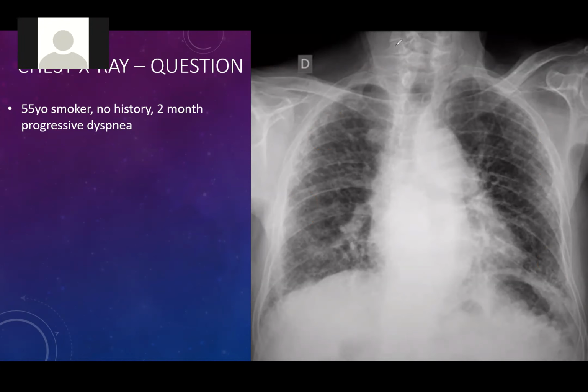In miliary tuberculosis, yes, very well, but it should be more nodular, and there are a lot of reticular densities, which is very uncommon in primary tuberculosis. So it's something with the heart, I think, because it can be heart failure, right? It can very well be heart failure.